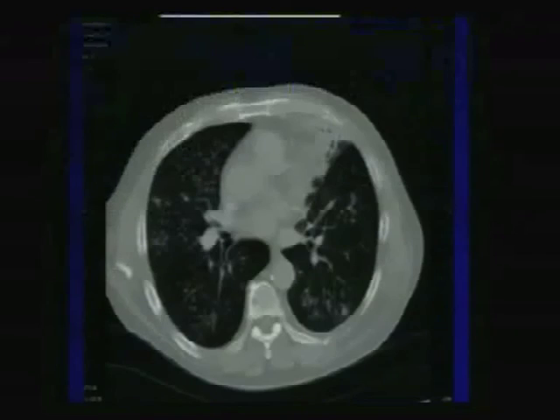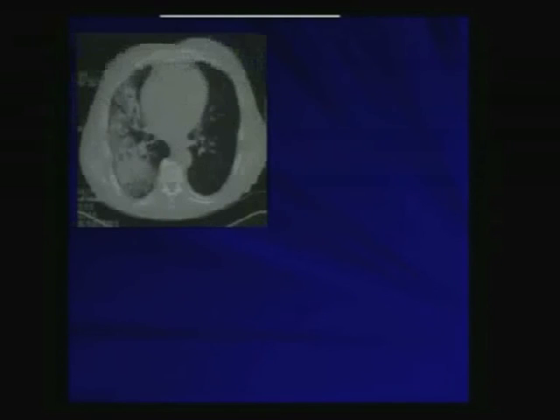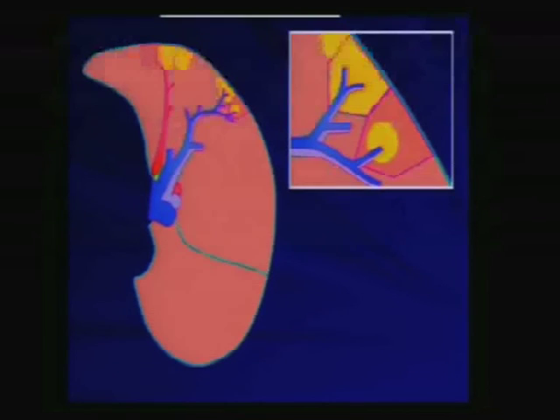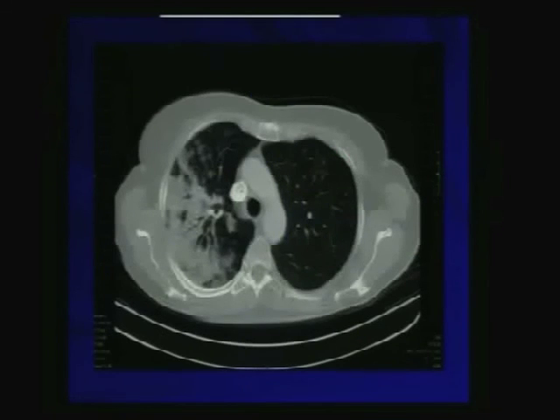Airspace disease and centrilobular pulmonary nodules, just remember they have a typical distribution. You have this basically like fruits at the end of the branches, and this is typical of a patient with early nodular disease due to airspace disease, and the typical example is early infection, but it can be seen in a patient with bronchoalveolar carcinoma, as we can see. But again, early changes have the typical tree-in-bud appearance in a patient with early alveolar disease that can evolve to airspace disease. So airspace disease is easily recognized when it's diffusely consolidated. You see the air bronchogram, but when it's early, then you can look for early non-specific nodular disease.